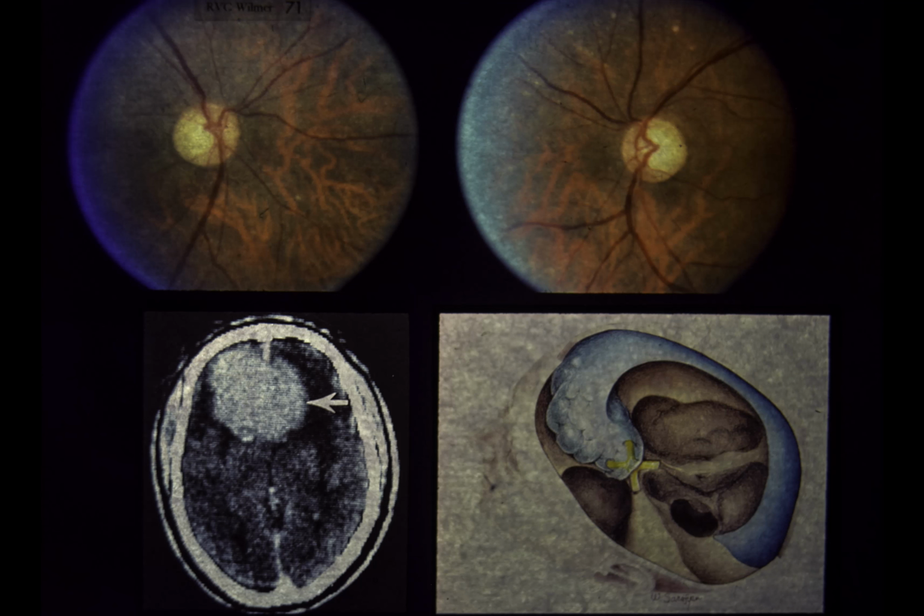Slide 71, optic atrophy and falx meningioma. This 69-year-old male had noted slowly progressive visual loss for at least 3 years. Recently, he had developed personality changes. Visual acuity was hand motions right eye and light perception left eye. Visual fields show small nasal islands of vision, upper left and upper right. Both optic discs are atrophic and the retinal vessels are narrowed.